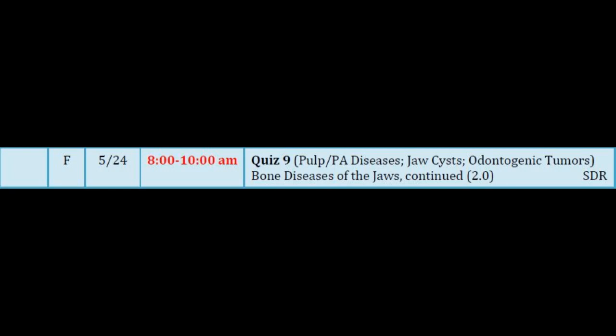Why do we have a distinct border at the superior aspect? Because we have an anatomic border, the floor of the sinuses, and that's different. But we even have some vertical expansion, so this is encroaching on the sinus space. This is a young man in his teens, and notice he has some facial asymmetry, but it's not hugely disfiguring, it's just the two sides don't match. So if we take an occlusal film, we can see the bony expansion very nicely. I think you've learned to do occlusal radiographs, and at this angle in view, we shouldn't see any buccal bone at all. It should all be tucked under the teeth, and here we see beautiful expansile area of ground glass bone with that uniform kind of stippled appearance. And then it just gradually transitions to normal toward midline. Doesn't cross midline for this patient.